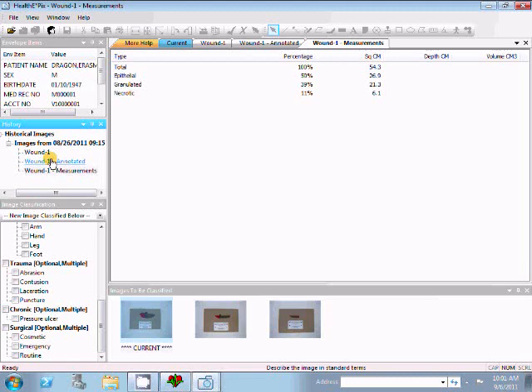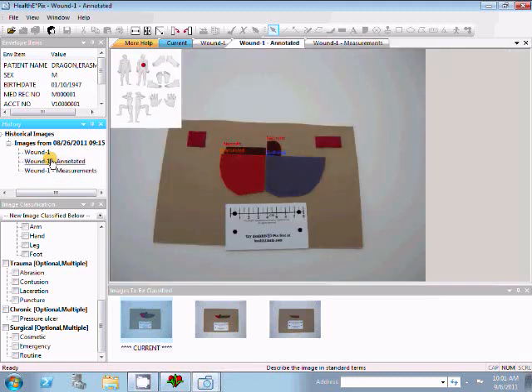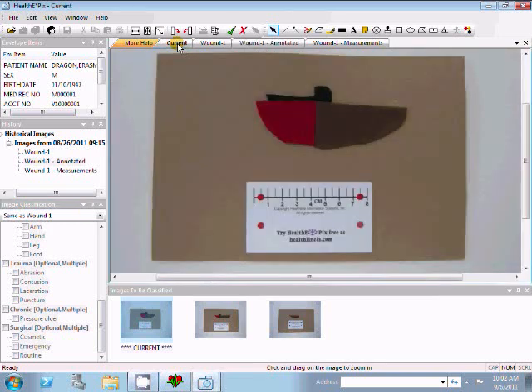When I view a historical image, the image classification checkbox adds that image to the drop list. So if this patient is returning for treatment of the same wound as, say, last week, I can choose the drop list item that indicates the wound is the same as that one. This is useful later because we can use the measurements to graph wound progress, which we'll discuss in a minute.